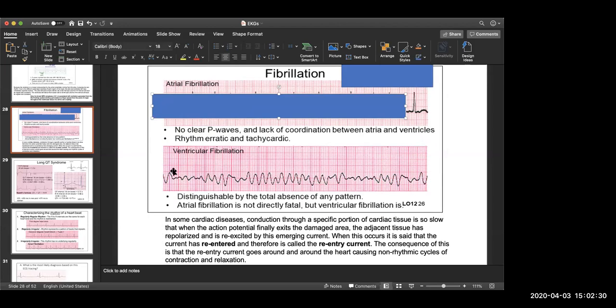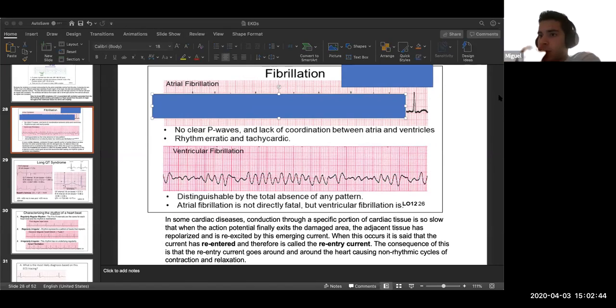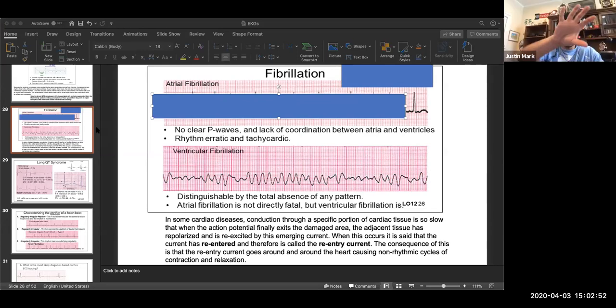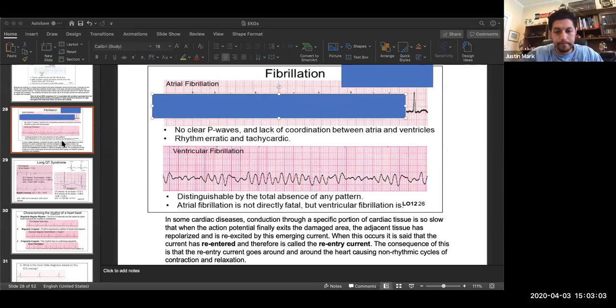Okay. Well, doesn't that kind of look like torsades though, because it kind of gets narrower and bigger? Yeah. So that's a good question. Torsades, you kind of have like that loop on the EKG. Torsades just means twisting of points, so you have to see it does the loop thing, and it twists before it does it again. Yeah, it actually turns a little bit, if you will. But I think it's because the amplitudes in this are pretty consistent. I think in torsades they change around a lot. So that's kind of why it looks like it's looping. Okay. So AFib and VFib.